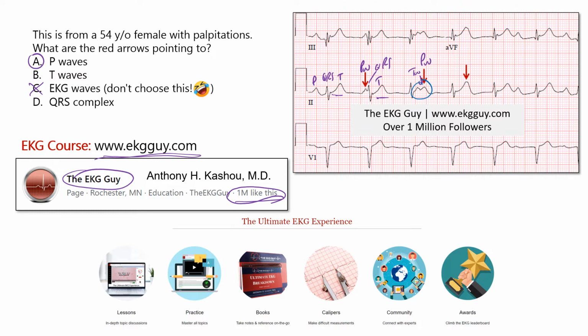If you look at the arrow at the end, if you were to just have this arrow, you may say, oh, this must be a T wave. Well, that's true, there is a T wave, but there's also a P wave there. And so the answer is not B, because we're not asking just what this arrow is showing, but in fact it's also including that first arrow, which does not show a T wave. Hopefully that makes sense. So this one, yes, there's a T wave here, but the T wave in this case is there, and this is a P wave.